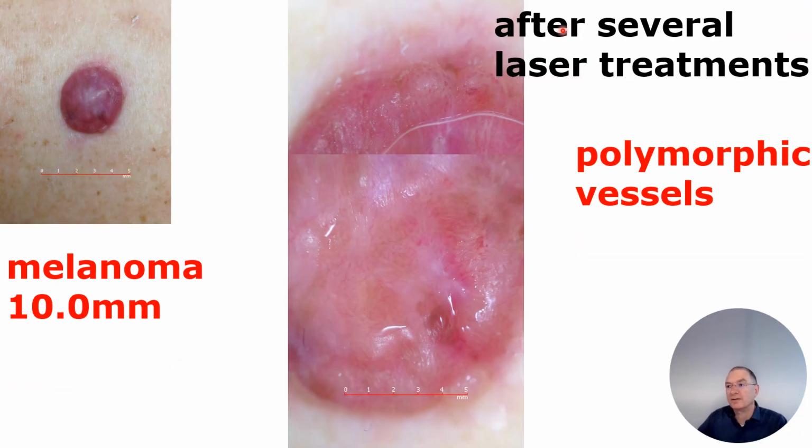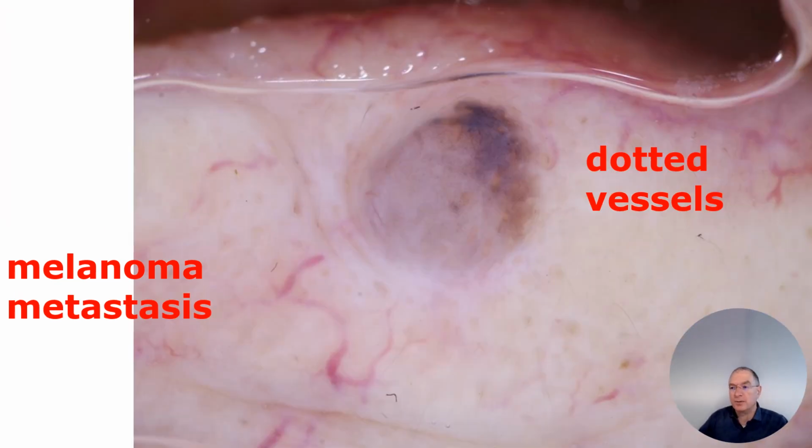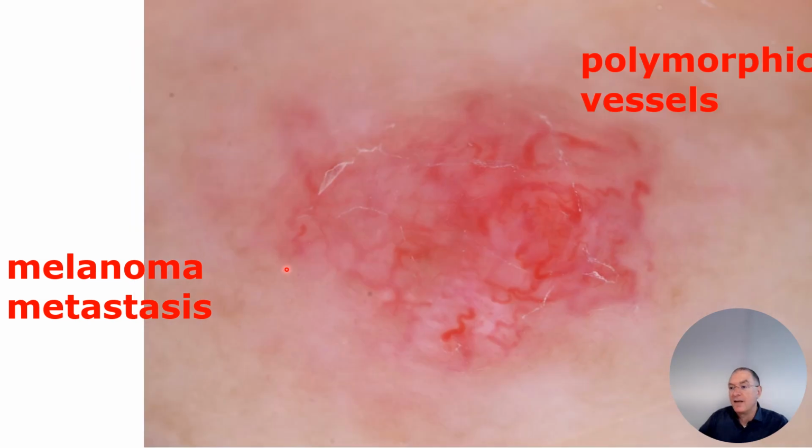10 millimeters tumor thickness after several laser treatments outside by a GP. What in the hell is this? He did it several times, and the tumor occurred and occurred again. We need histopathology, and the patient came to us: polymorphy of vessels, melanoma 10 millimeters. Dotted vessels here, eccentric hyperpigmentations, melanoma metastasis, polymorphia of vessels. I don't know, are they arborizing vessels or not? Cut it out, but this is chaos for me.